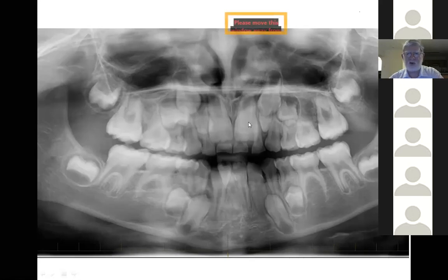1-2 there. So this one's twisted 90 degrees. It doesn't look like it's ever going to be nicely positioned to resorb the root of that 2-2 away to push it out as it comes down. So time will tell. This patient's got a lot of growing to do still.